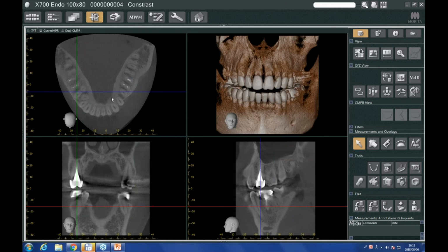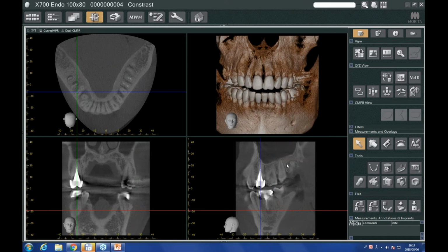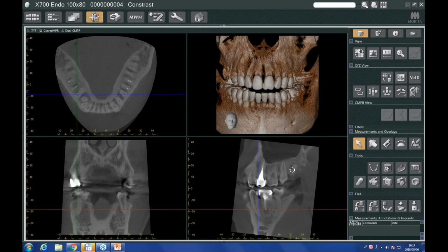This would be the general view of my patient. And again, I want to look at the maxilla, the mandible. Make sure everything is oriented the way I would like. And now I'm going to look at the curved multiplanar reconstruction, curved MPR. This is basically where we're drawing our panoramic curve and our cross sections. This is very typical of analysis that you receive from a radiologist.